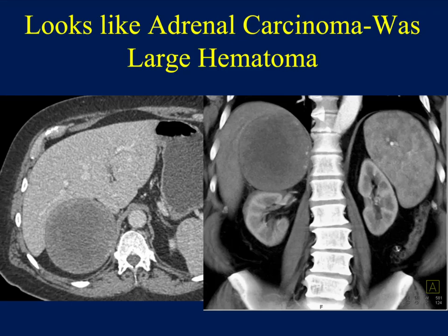Look at this example. Now, this was a patient with an incidental finding of this large right adrenal lesion. And this is the point I made before. We've seen atypical adenomas. I showed you that. This was resected because we couldn't figure out what it was. It wasn't aggressive. It wasn't enhancing, but it was a large mass. The patient had at best minimal to no symptoms, but no one felt comfortable leaving this alone. You wouldn't want to biopsy it because it could be an ACC.